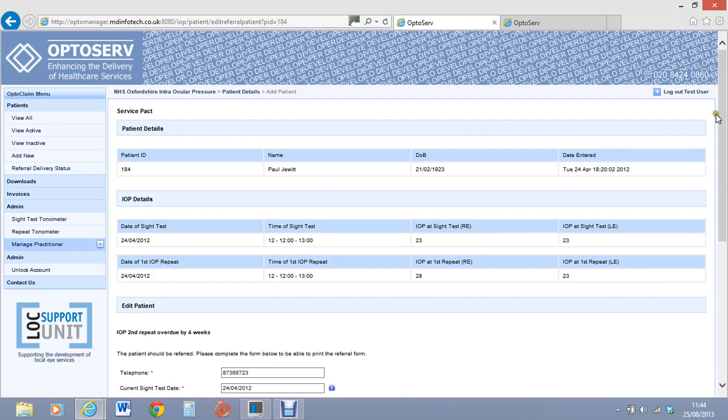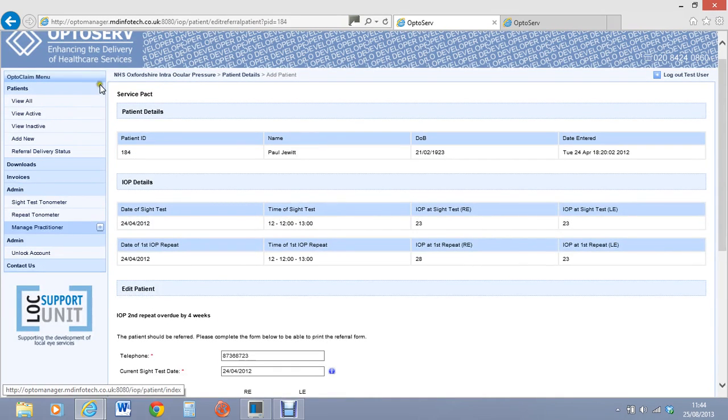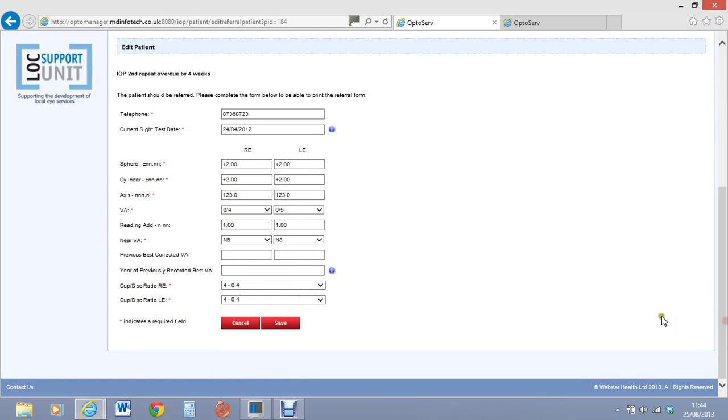Now, that big A there is a good thing to remind you to do it. But if you leave it, what's going to happen for us is, when I go through and check the IOP refinements, and I get a printout every 3 months of everything that's happened, and I'm going through and auditing it, I can see those practitioners that have basically forgotten patients.